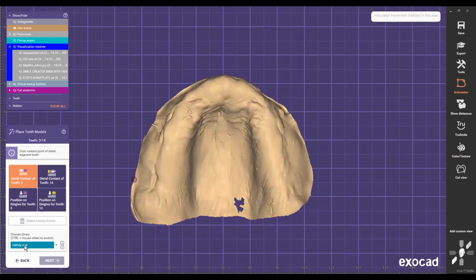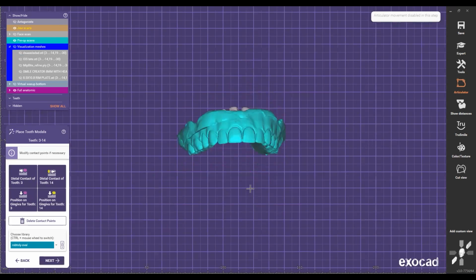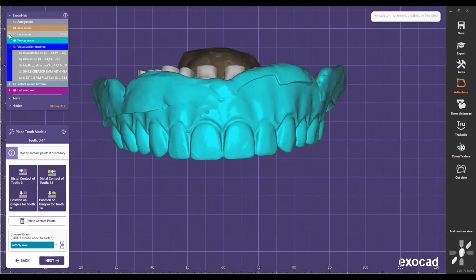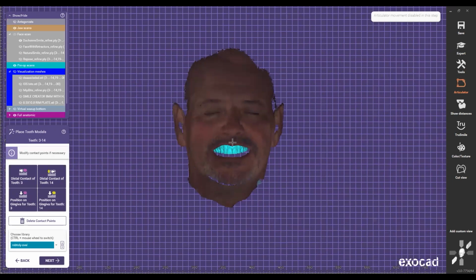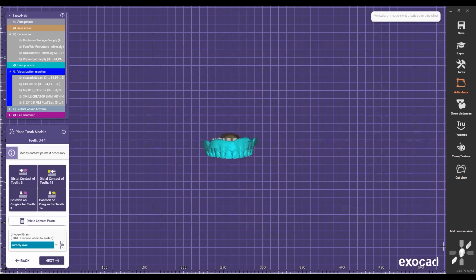So now I'm going to go ahead and select, I like to use the Rob Tully oval shape teeth. From here, I need to know what's going to be the ideal size of these teeth, right? In this case, he's a big patient based on his face. I can see that he's a big male patient, probably like 5'11", 5'12". He's a big guy. So that means I'm not going to give him small teeth. I need to make sure that I give him at least 8.5 to 11 millimeters size.